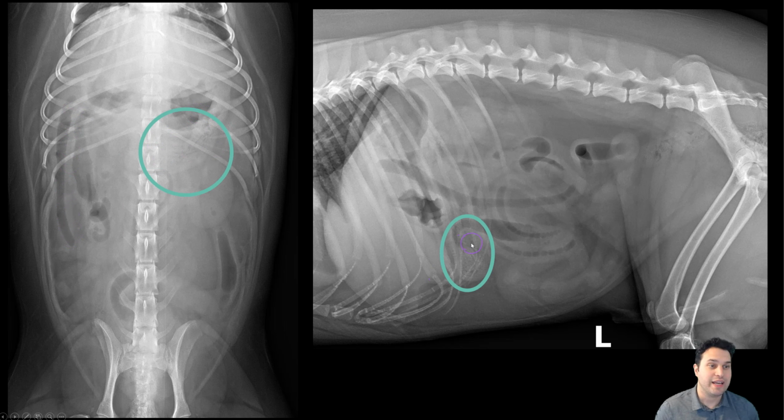Over here we have our intestinal foreign body. There's this striated soft tissue and gas material. This is the sock within the intestinal segment. But we notice that we can again see that nice line of the duodenum and the pyloric antrum, no foreign material there. So even though this patient ate a cloth foreign object, it does not have a linear foreign body.